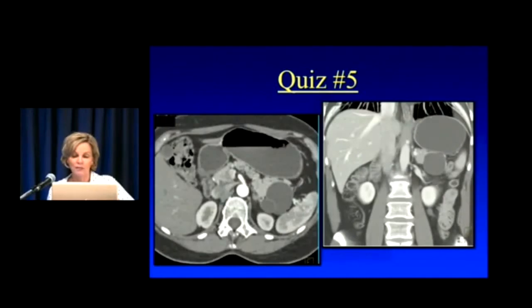And here we have a cystic lesion off the tail with a very pretty exophytic appearance with a thin internal septation. Here you got to get into the demographics of it, but what this could be is a lymphoepithelial cyst. You could do an EUS, and you could look and see if they have the squamous cells. If the patient's not symptomatic, you could follow it, right? You could see if there's mucin in it. There's no suspicious features. Or this could be a serous cystadenoma, an oligocystic, and that's what it was in this case, an oligocystic serous cystadenoma.